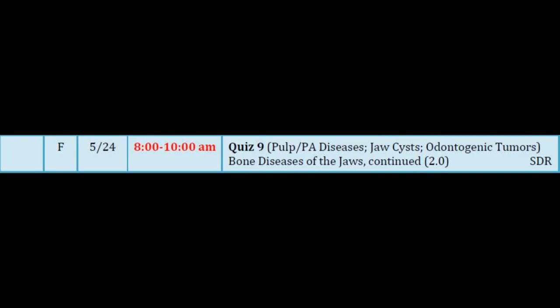Questions 2 and 3. Our 35-year-old with gradually increasing jaw swelling. Two tumors should be included at the top of your differential diagnosis. How would you describe the lesion? Lucent, opaque, or mixed? Lucent. Multilocular or unilocular? Multilocular. What is its location? Posterior mandible. Okay, so what are good diagnoses for a multilocular lucency in the posterior mandible as an adult?